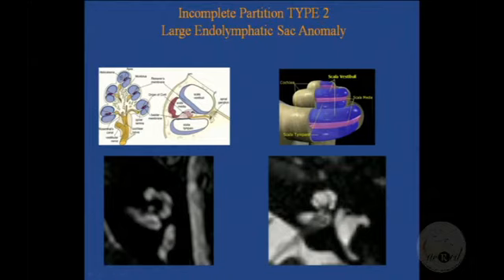And this is the whole image of the left temporal bone. When you take a long time and adjust the matrix size, you have to tweak it. You have to do a lot of trial runs. And once you cook it up, you can actually see the internal details of the cochlear turns. That's the basal turn, and you can actually see the membrane, that structure within the basal turn there. And the scala vestibuli and the scala tympani should be equal in size proportion.